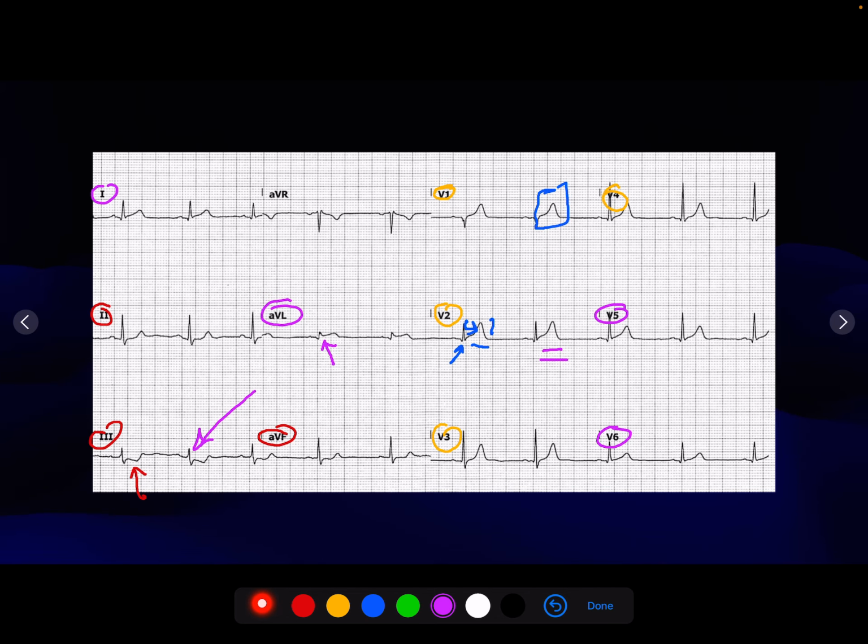It's close, it's kind of borderline, but a lot of people classically could look at this and say, hey, this doesn't meet criteria. Let's sit on this patient, let's get some cardiac enzymes, let's maybe do some serial 12 leads, maybe admit them to CCU, maybe then go to the cath lab in a day or so, and treat this more like an NSTEMI, if you will. When in fact this is somebody who needs to go emergently to the cath lab.